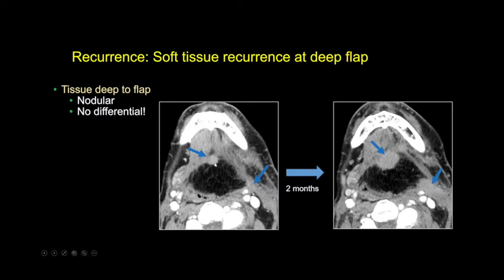This is recurrent tumor. Now, 2 months later, we can see how this has gotten so much larger. And there's probably another tumor deposit right there. But something that we may not have noticed was the recurrent tumor posteriorly. At this stage, we might have just interpreted this as the flap margin. It's not really mass-like. It's not particularly enhancing. And I certainly would not have called a tumor here unless I'd had a PET scan. Here, however, look at the difference.